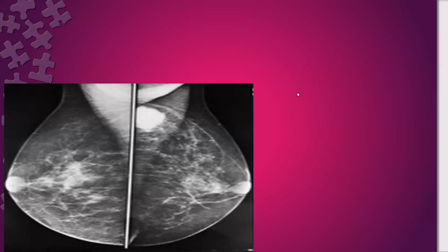I see something resembling a mass. Okay. Irregular mass at the right breast, centrally. Where exactly? You can describe by location. Where is the mass?